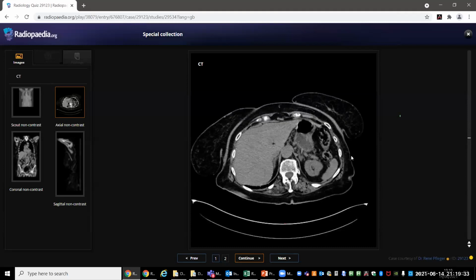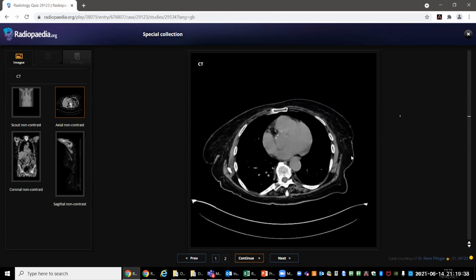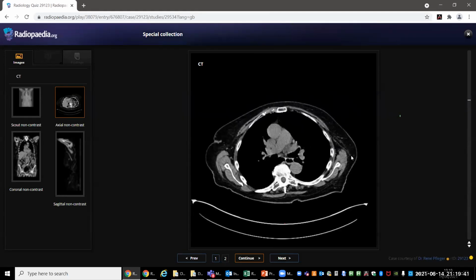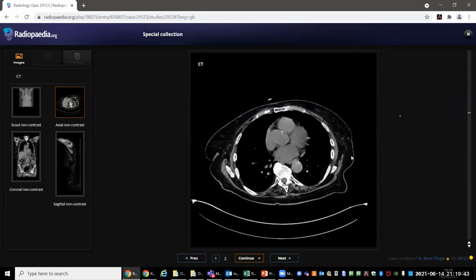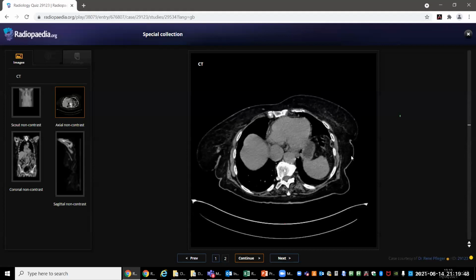Yeah, it might be the breast, which is not adequately visualized on CT. Concentrate on the breast. Do you see anything? Yeah, there is some nodule in the right breast, ma'am. Tell me when to stop. Yes, ma'am. So I can see that there is some nodular lesion in the right breast, which may be suspicious, or it needs to be correlated with other modalities like mammography and ultrasound to further evaluate the lesion, ma'am. Okay. So you want to further evaluate this? Yes, ma'am.